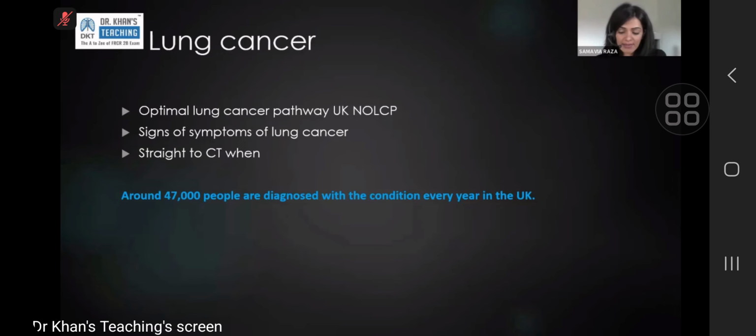A lung cancer, this is a scientifically proven fact, a cancerous nodule can get smaller and then get bigger. So a nodule that went from 6 to 4, could it still technically be cancer? Yes. Why is that? It's because it induces almost a fibrotic reaction. It pulls the lung around it. So on a radiological technique, what you will see is that it looks a bit smaller. The change is very subtle, but it is a well-documented fact that cancerous lung nodules can get slightly smaller.